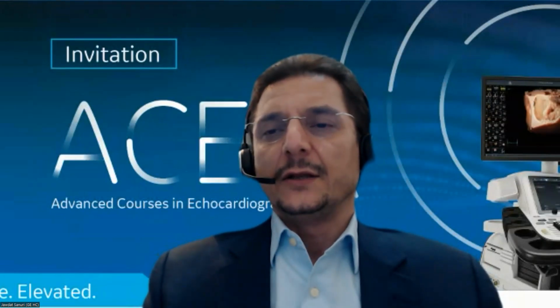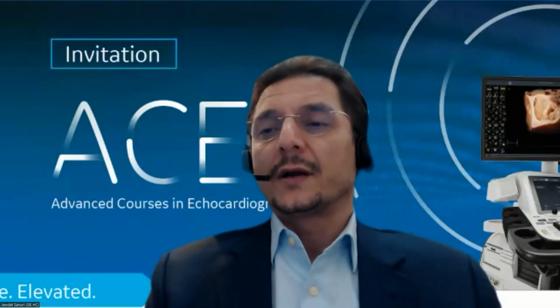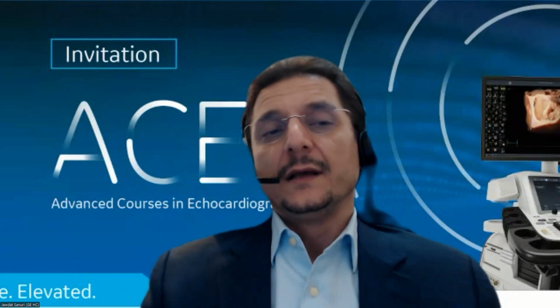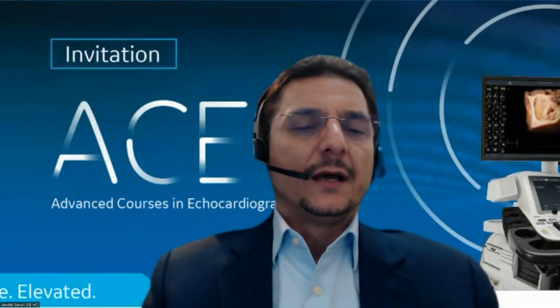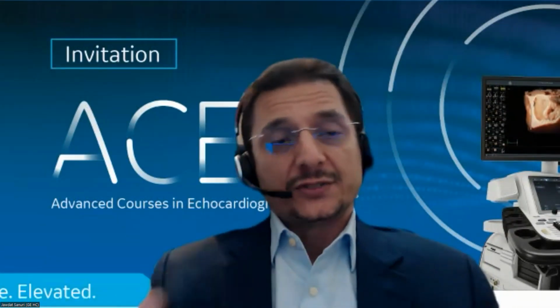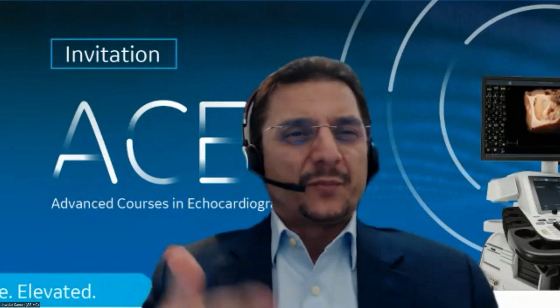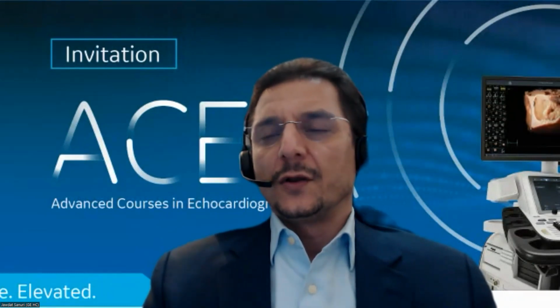Yes, absolutely, I agree. That's the whole idea, because you have a quantitative value for the global longitudinal strain, and you have the bullseye also to compare. So whether it's global hypokinesia or ischemia or regional level, you still have a good measure. Especially for regional, because overall ejection fraction might not change much if there's improvement or deterioration, but at least the regional, segmental strain, as well as the global, and the bullseye, which represents again the coronary perfusion or perfused areas within the myocardium, and their strain values will be a good way to follow up for such patients.